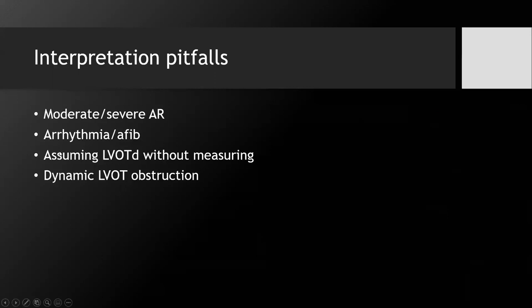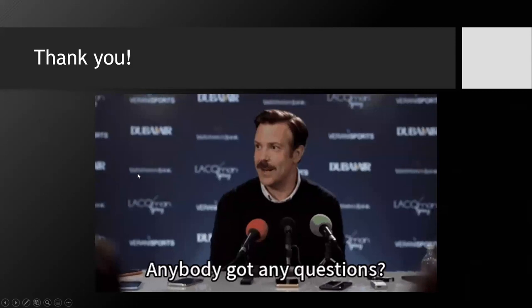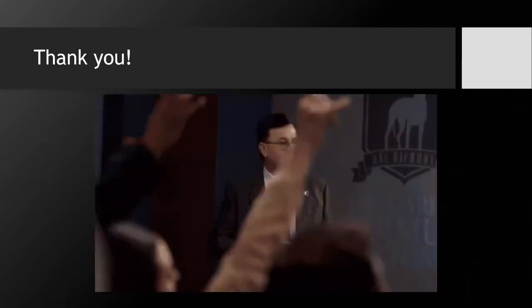The other interpretation pitfall is what Chris was alluding to, right? Where people assume the LVOT diameter without measuring it and could lead you astray. Tread carefully. The other thing that we're going to have to talk about another time is where a patient has a dynamic LVOT obstruction, and that will affect the velocities of flow throughout the length of wherever it's moving. That's going to be a conversation for another time, but important to realize that if you do think they have a dynamic LVOT obstruction, hypertrophic cardiomyopathy, or just a hypertrophic septum with a patient with low flow, be cautious about using your cardiac output. And I will pause there for questions.